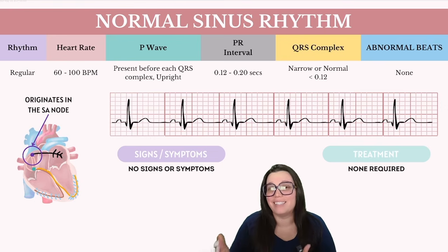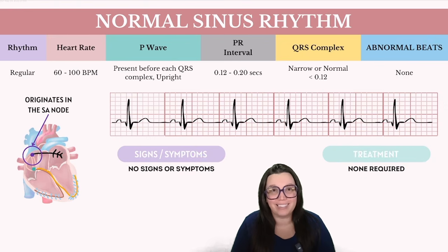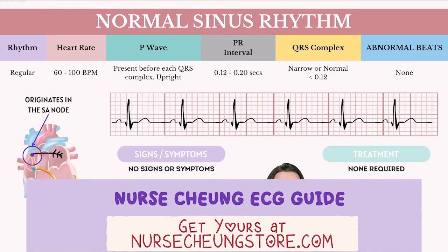This rhythm really is textbook, and it describes what we should see when it comes to a standard, healthy heart rhythm. It typically presents with no signs or symptoms, and it doesn't require any interventions or treatment. Such a rhythm indicates the heart is functioning appropriately, efficiently circulating blood throughout the body without any disturbances.